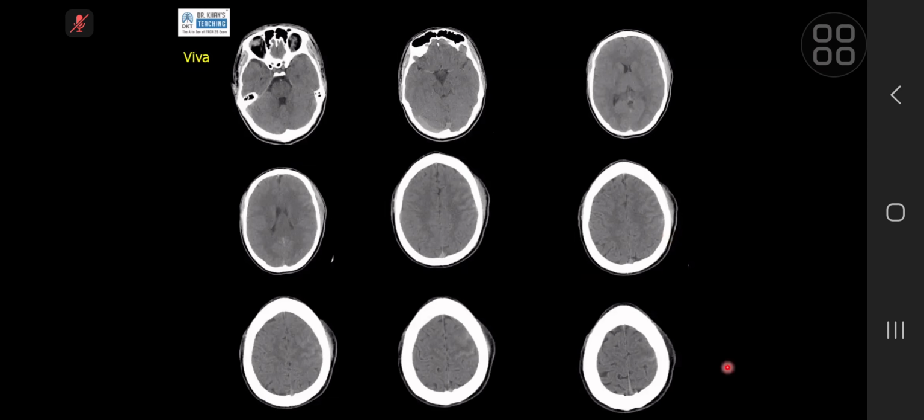You can also get this kind of a case where the subarachnoid hemorrhage is not hyperacute, it might be 2 or 3 days old. Look at the sulcus here versus the sulcus here. The sulcus has got some material. When you see that, you should be worried about subarachnoid hemorrhage, but also about leptomeningeal processes like leptomeningeal carcinomatosis or infections like TB.